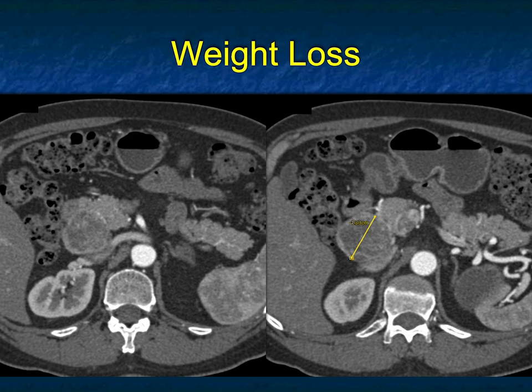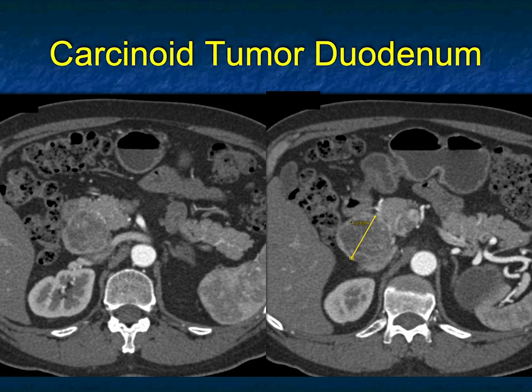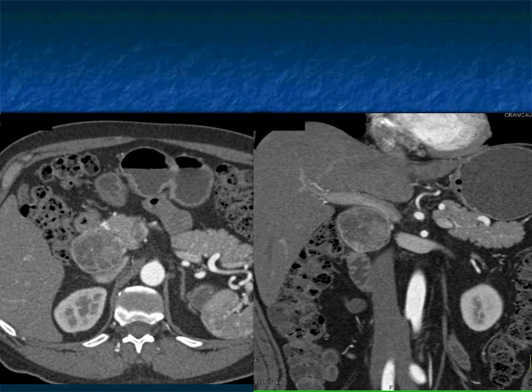The two tumors that come off the duodenum I mentioned are GIST and carcinoid. They can be very vascular in this location. Obviously, so can carcinoid. The patient had endoscopy with biopsy, and this was a carcinoid tumor. Carcinoids of the duodenum are not uncommon, usually smaller, and more likely intraluminal compared to GIST, which are typically exophytic.